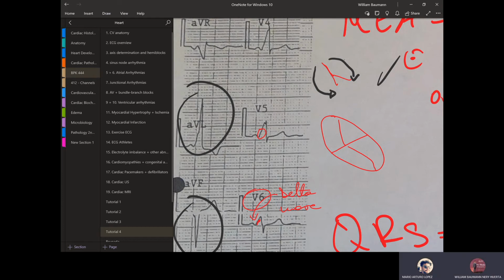Okay, so if you know your chest leads, it's going up, which means that it's the most common one, which means that it's on the left. What do you mean by it's going up? Like the delta wave has an upward trend versus a downward one. That's kind of what I remember from that. And I know that if that's the case, then it's the most common one, and that's on the left-hand side of the heart.